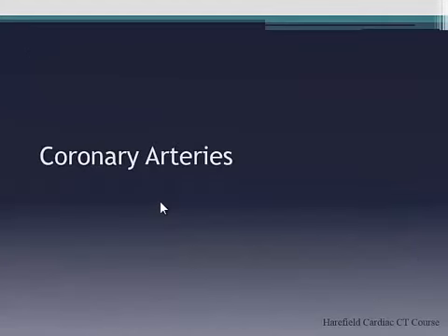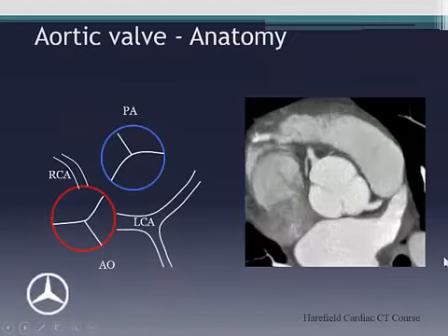Okay, moving on to coronary arteries finally. So we've already said when you've done a double oblique view, you should get the pulmonary valve as the most anterior valve, and there's your right coronary. Now, normally you get the interatrial septum here. So the interatrial septum, you know from echo, for those of you who do echo, will always abut the non-coronary cusp, or the non-coronary sinus.